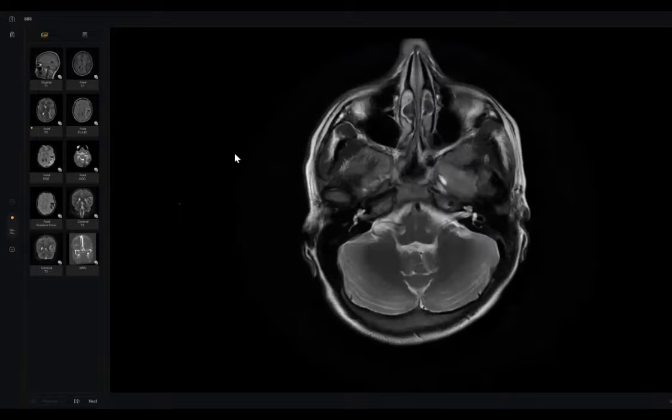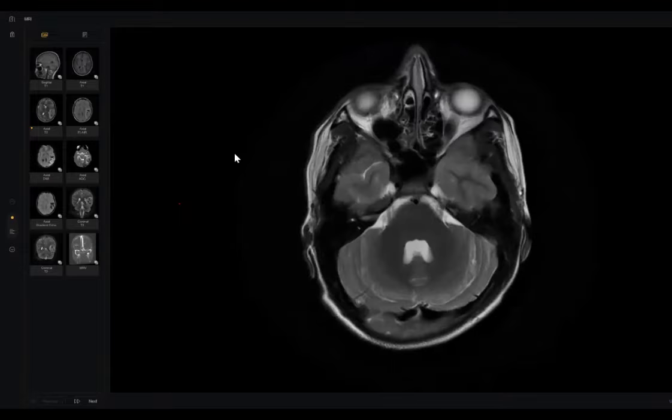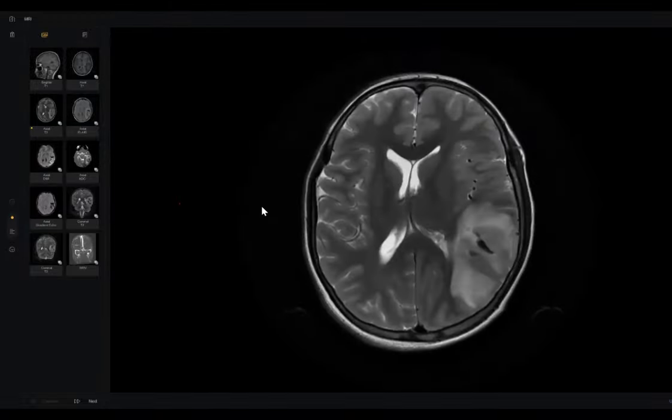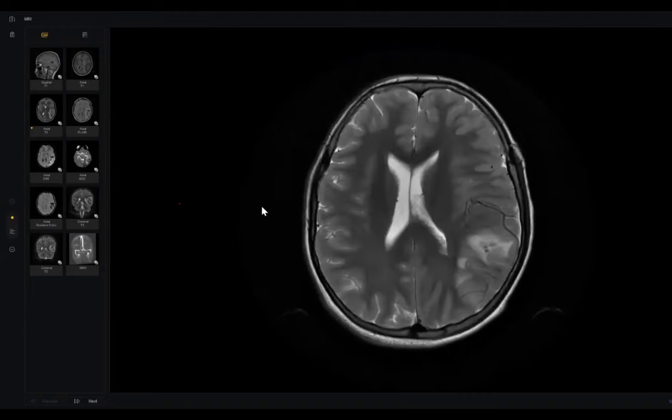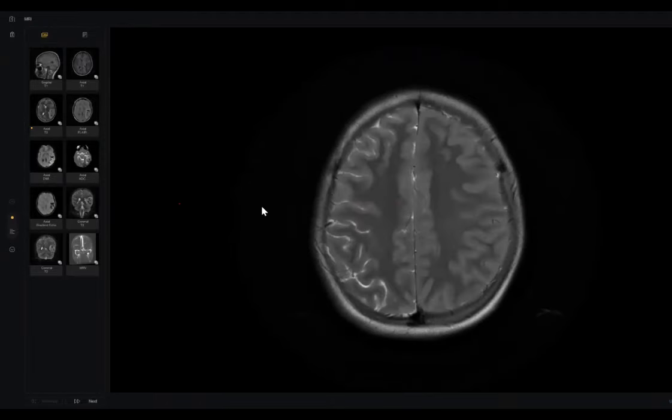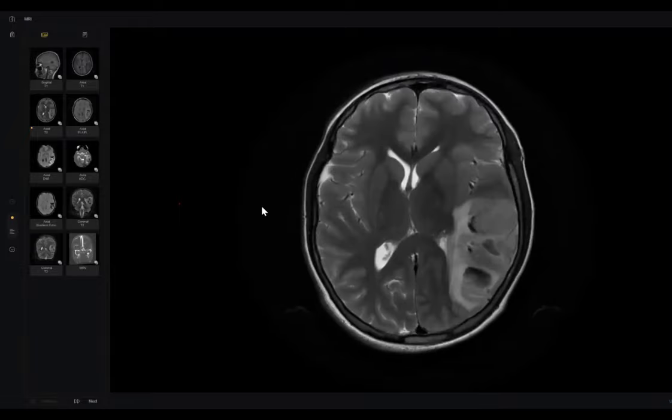I can't see the transverse sinus. If the sinuses are intact, I mean there's no thrombosis, the cause could be arterial. There is also significant edema of the ipsilateral cerebral hemisphere. I can see effacement of the sulci and gyri.